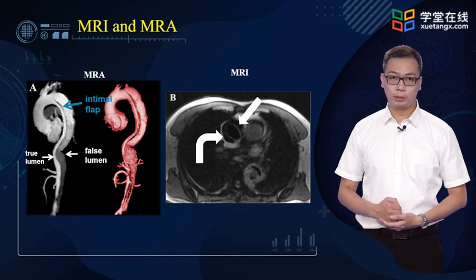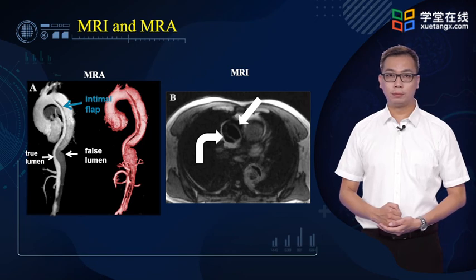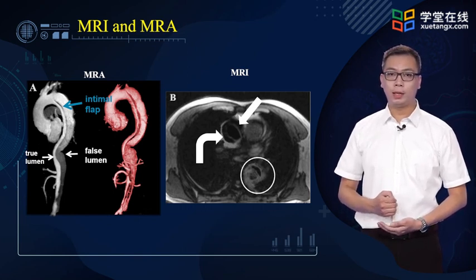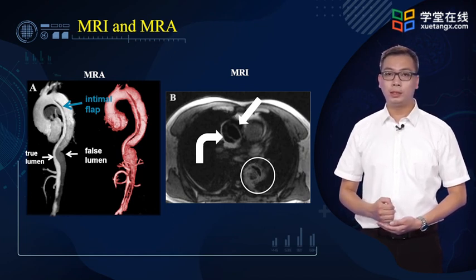What are the characteristics of aortic dissection in routine MRI? The axial ECG-gated spin echo image, Figure B, shows type A dissection with the dissection flap clearly outlined in the ascending aorta, arrow, showing persisting false lumens, curved arrow, above the ascending aorta. The configuration of the descending aorta is less clear with variable signal, suggesting either thrombus or slow flow in the false lumen.